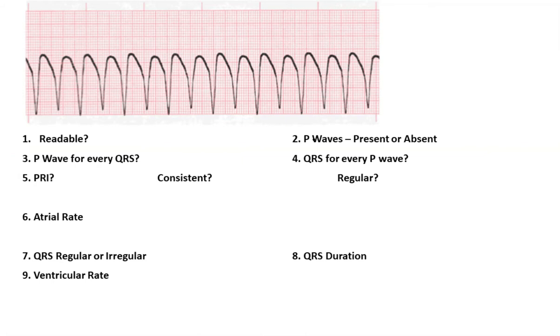Hey, how we doing? All right, so we're going to take a look at a ventricular tachycardia and try to follow through step by step with some rules that we can take a look at.